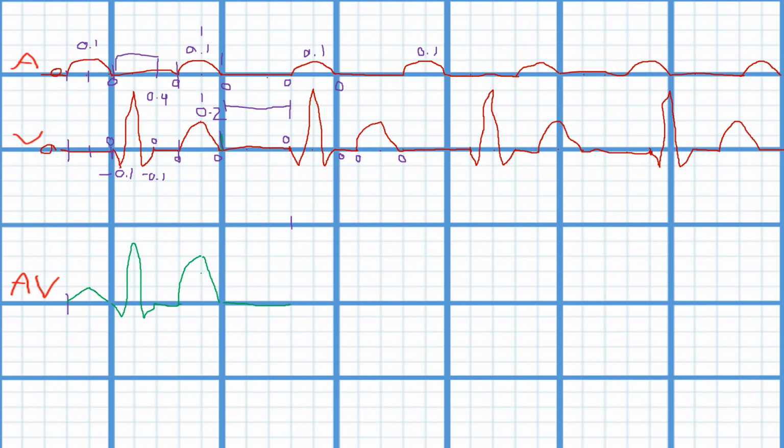All right. Now, this is where I have to start looking at things very closely. So one of the things is you see this dip of negative 0.1 millivolts. But you look right here, we got half of a millivolt going the positive.